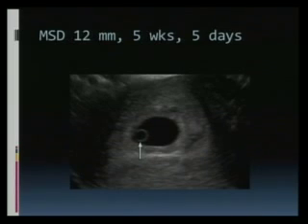Okay. All right. So 2 or 3 things that I want to point out in this particular image. We will not be able to finish this right now, but we should at least start it. Yes? At which points are we actually measuring? Are we measuring the hypoechoic or the outside volume? We are measuring within the hypoechoic, just the hypoechoic. We are not measuring the decidual reaction.